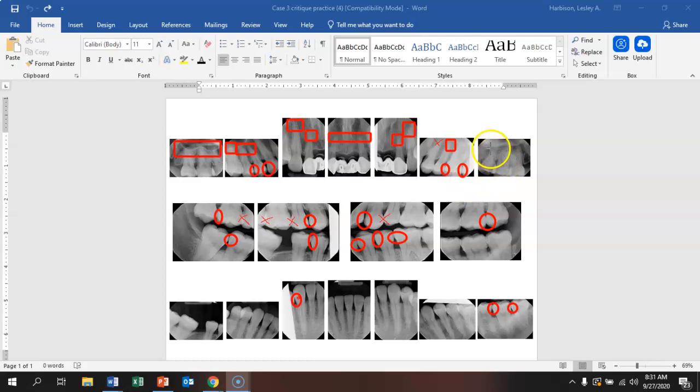So then for our molars, we have all of our molar apices there. So we're good there. We cannot see any of our apices in these shots. We do have our canine. We do have all of our incisors. We have our canine and our first premolar. We do not have the second, well, oh, is that 2 millimeters? Again, this is hard to say unless we can zoom in, because then we can actually measure it.